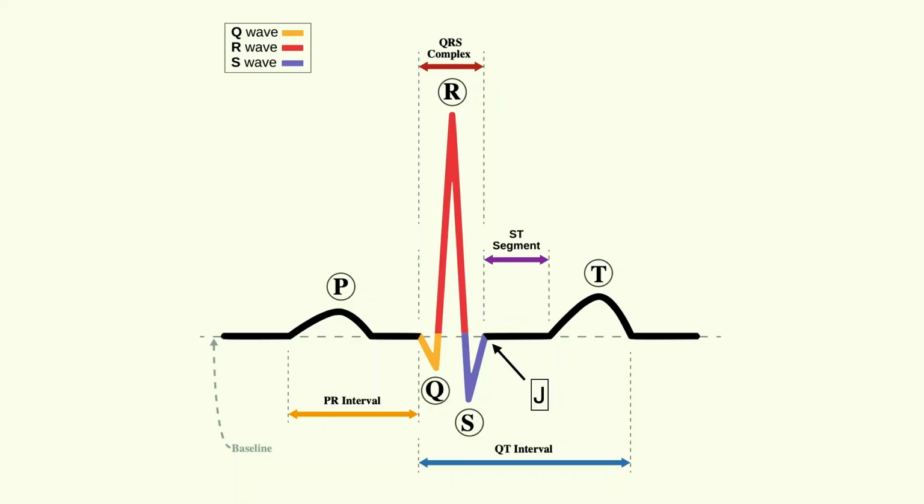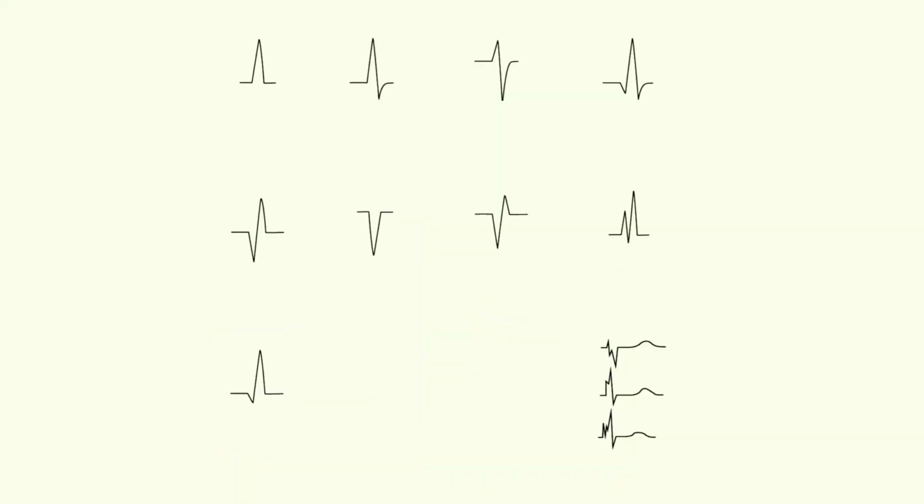Now, the QRS complexes can look a lot of different ways, and you might actually see a stylized way of describing these. So for example, this, although it's a QRS complex, it's just an R wave, right? R means it's the positive component of it. And so there's no negative either at the beginning or the end, so it's just an R wave. And you can still call it a QRS complex, but if you were to write it, you might write it like that.